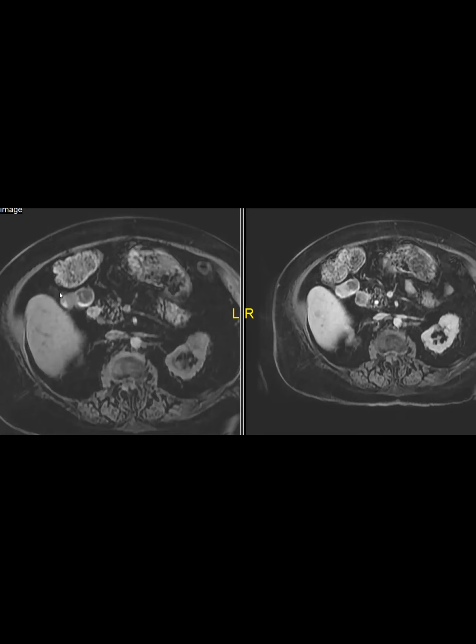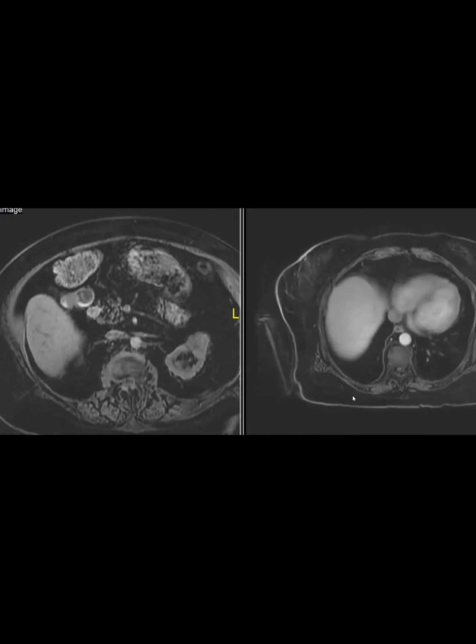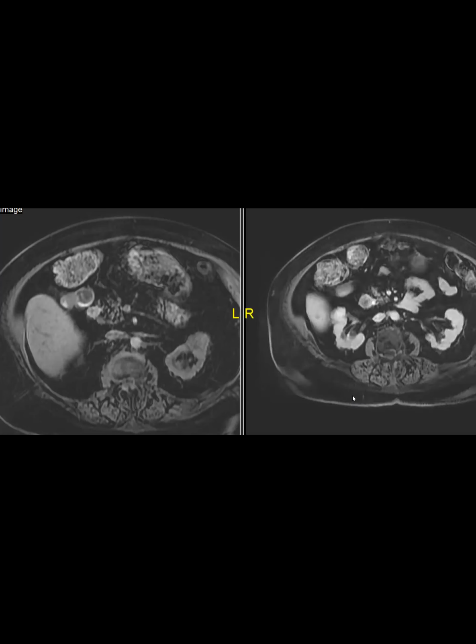It's hard to see, but on orthogonal planes, you'll see it nicely. And I have a question for you about your hepatobiliary phase. I know you are now at a new institution. Are you using hepatobiliary agents for HCC screening, and what are you using it for?